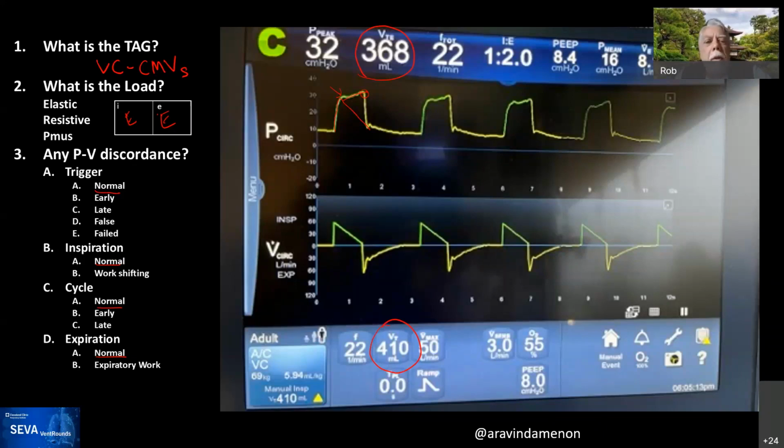I'd have to think about how this ventilator works, but circuit compensation means that the ventilator puts out more to make up for the volume that is compressed in the patient's circuit during inspiration. And without that, you would always exhale less than the ventilator put out. So that is a potential. That's a very good idea. BTPS not achieved, not likely.